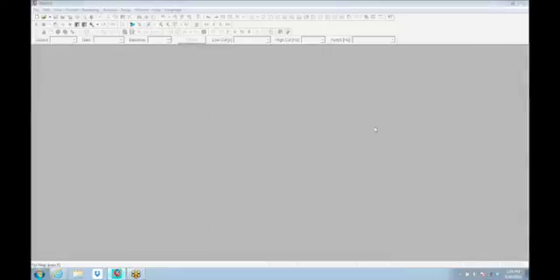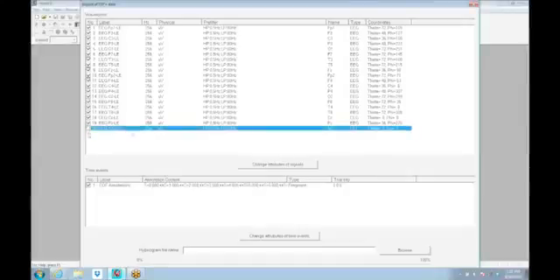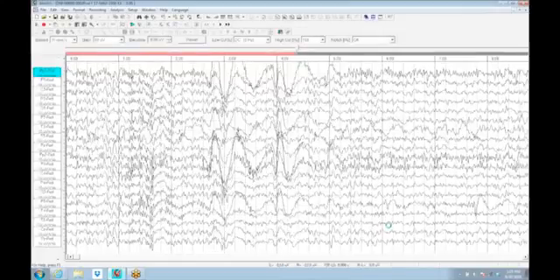Here, let me just pull an EDF Plus file in. The EDF Plus file lists all of the electrodes, and sometimes you'll get an FPZ or an OZ or an extra electrode set in there that aren't on a normal set of maps. Here, for instance, everything is linked ears, but A1, A2 we can turn off, because that's a channel that wouldn't be analyzable under a linked ear montage. And at this point, I hit enter, and it imports all of that data.